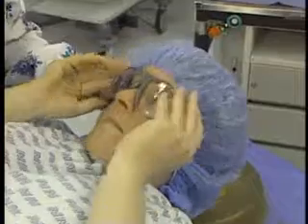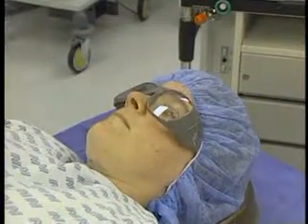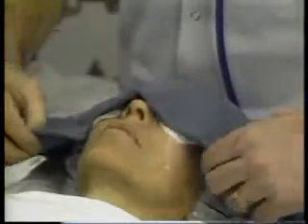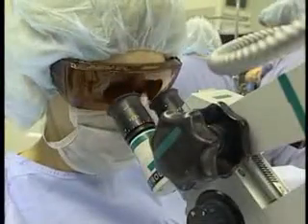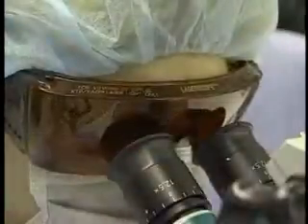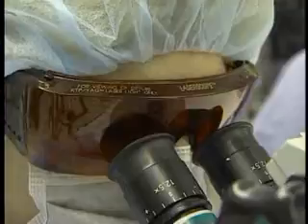When using the laser through a microscope or endoscope, appropriate eye protection is also required. Fiber optics can break at any point in the system, creating a hazardous situation for those in the room without protection. Each laser wavelength affects the eye differently, resulting in specific types of eye damage. Ultraviolet lasers exert a photochemical effect on the cornea and lens, causing scarring and cataracts, while the CO2 burns the cornea and sclera.